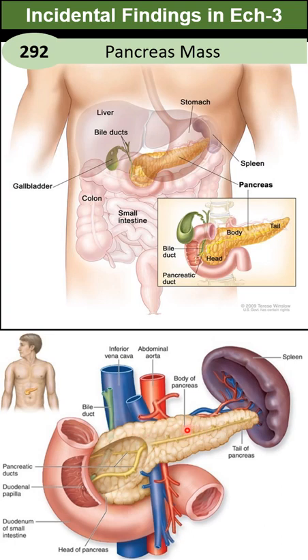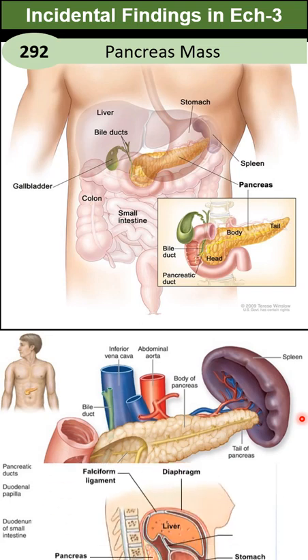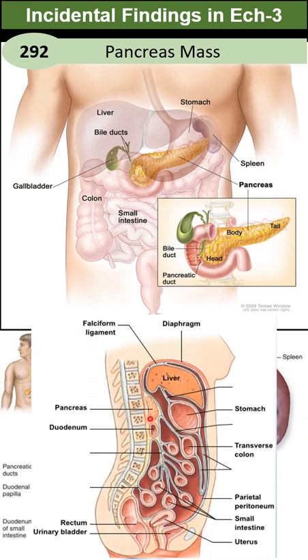Posterior to those, we don't have any structure except the perirenal space, which includes some fat, connective tissue, paravertebral muscle, and rib and vertebra, depending on which level we are. We don't have any other structure posterior to the pancreas at those levels.